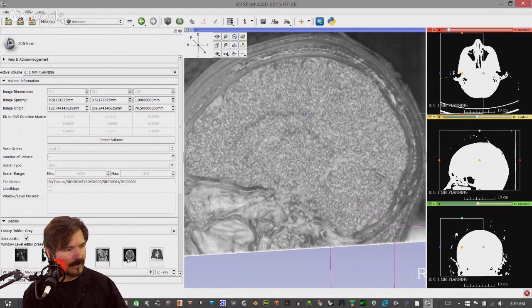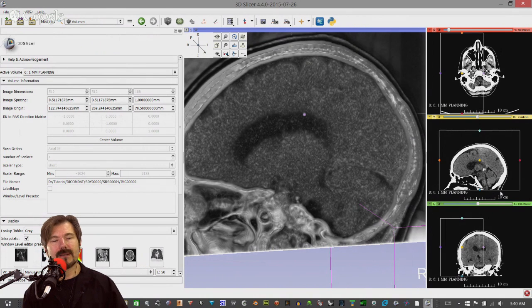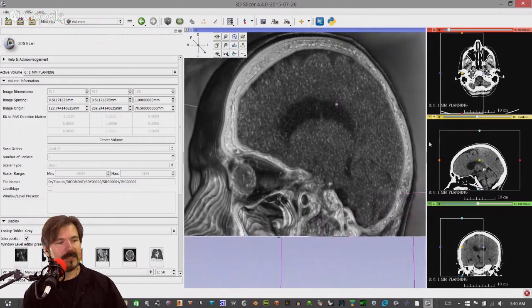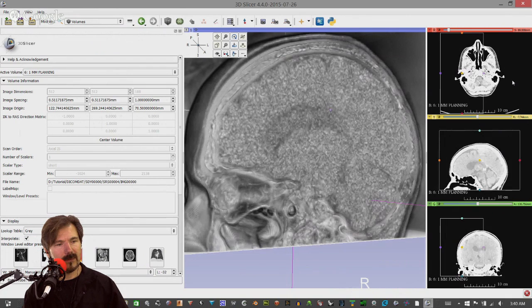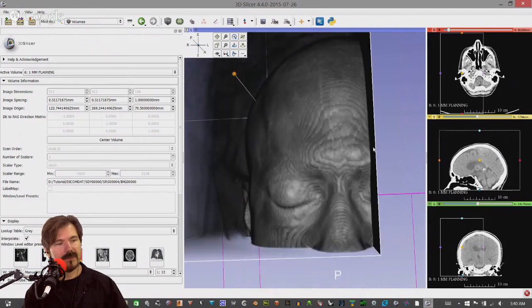And again, these are all for, well, we are using CT. So let's do the brain one. Notice immediately we have the proper thresholds. We get a much better view. Everything is peachier. And then if we wanted to, now we can modify and get a much better control over it.